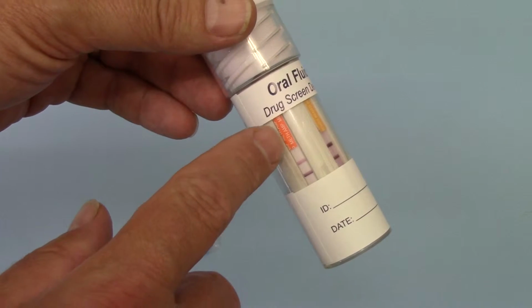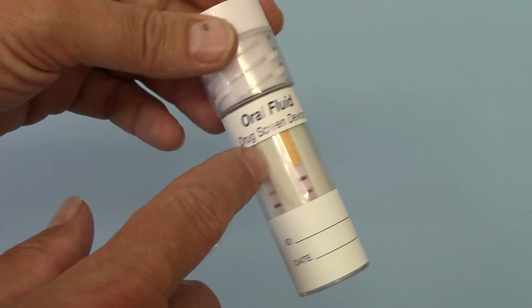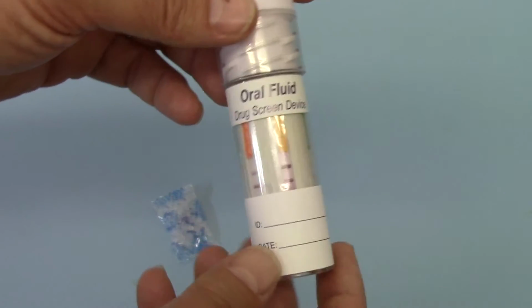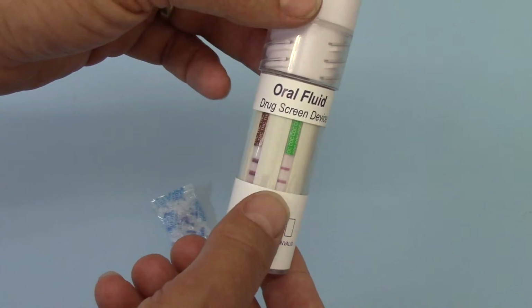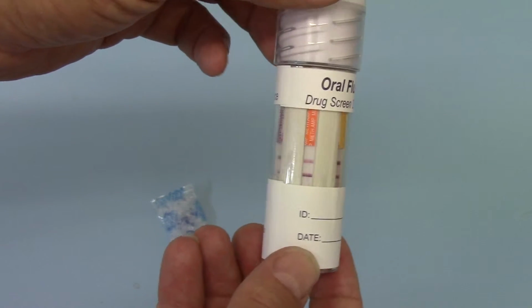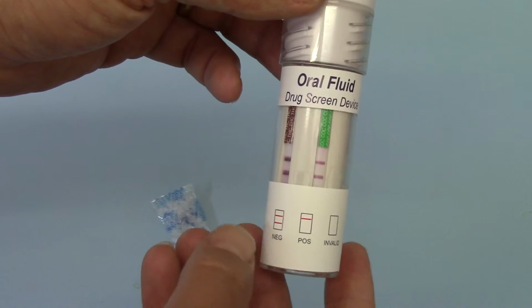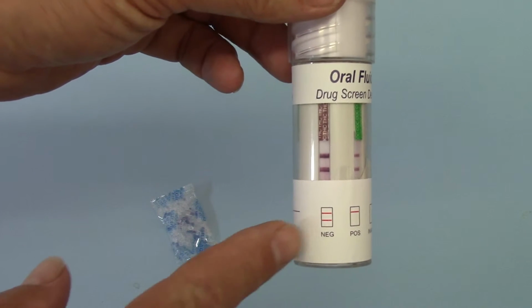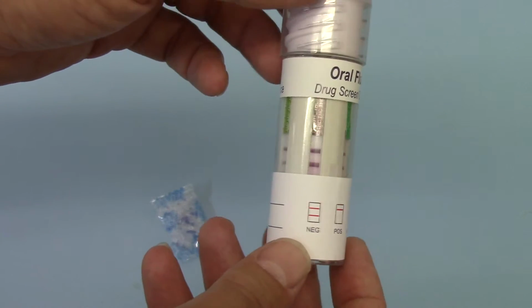The drug being tested is indicated by the international abbreviations on the coloured part of the test strip, and then you're looking for test and control lines to form with a nice clear background. And on this membrane, as we rotate it round, you'll see that we've got very nice, clear, easy to interpret test and control lines showing, indicating, as on your indicative panel here, fully negative results.